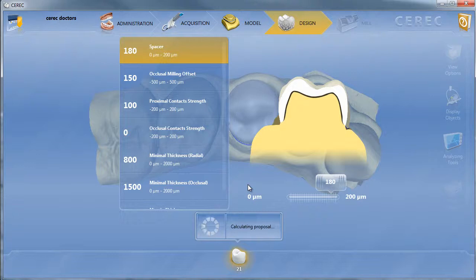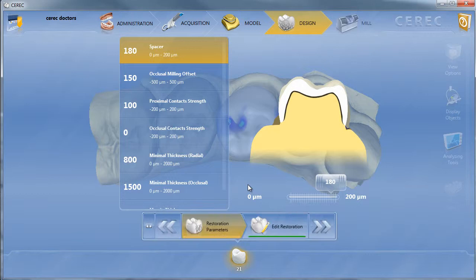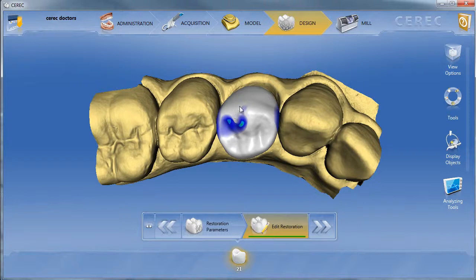So you have to be very careful with this step. You can inadvertently remove all the designs that you might have done for the previous few minutes when you change your parameter settings. So you must approach this very carefully. In fact, we recommend you do not alter your parameters once you've established them in the configuration menu. Otherwise, you can undo all the designs that you might have done previously to that mill step.